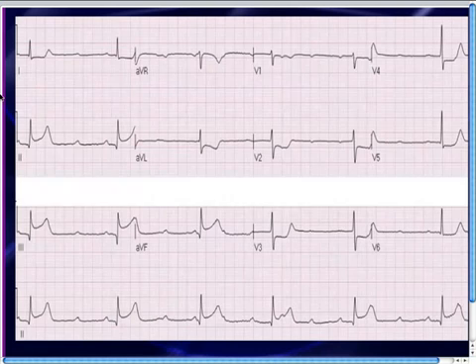Once again, you simply look at the PR intervals. If you take a look at the PR intervals everywhere where there is a PR interval, you take a look at that PR, and then that PR, and that PR, and so on, and you notice that the PR intervals are randomly changing, and that means that this is a third degree heart block.